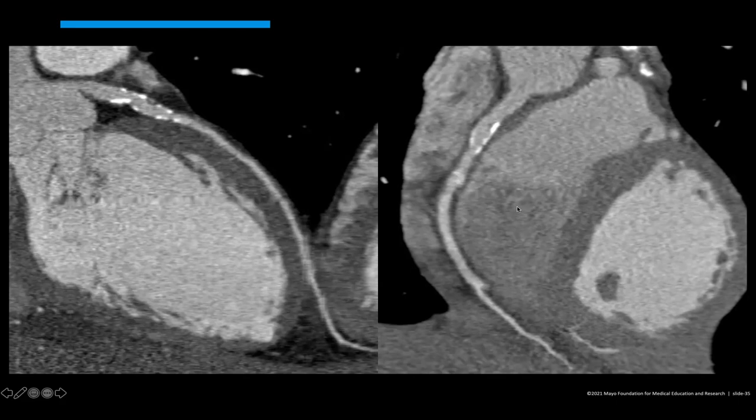And so which chamber is this? And I'm pointing. Sure, so that'd be, I believe, the right ventricle. Correct. The interventricular septum is going to be between the right ventricle and the left ventricle. And so that would make this chamber over here which? Oh gosh, okay, so this is kind of a coronal oblique view. You have right lung over here, left lung over there. So would that be the right atrium? Yep, you have the right atrium and then the right atrial appendage coming up here.